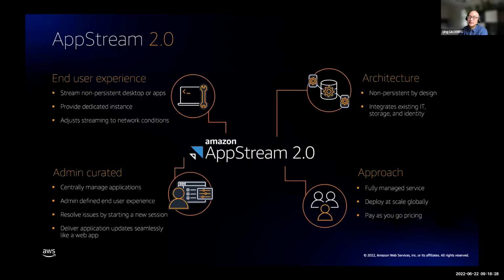So in this case, we are using the 3D Slicer desktop application, but we deploy that in AppStream, which will allow our users to just use their browser to connect to the AppStream instance that's dedicated to that user and start using 3D Slicer in the browser. So you can think of it as a remote desktop, but everything happens within a browser.